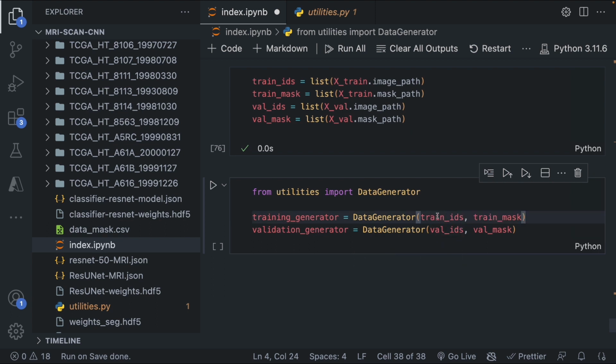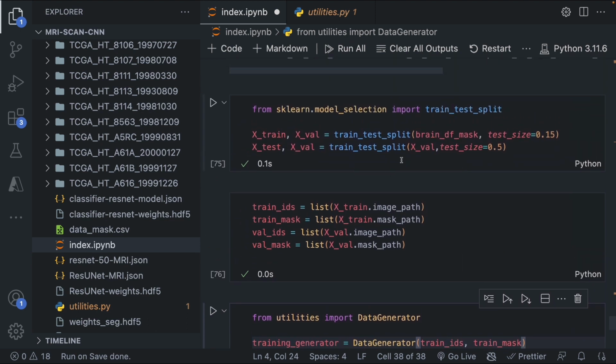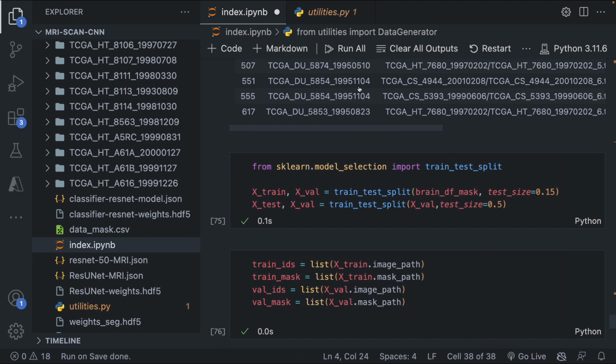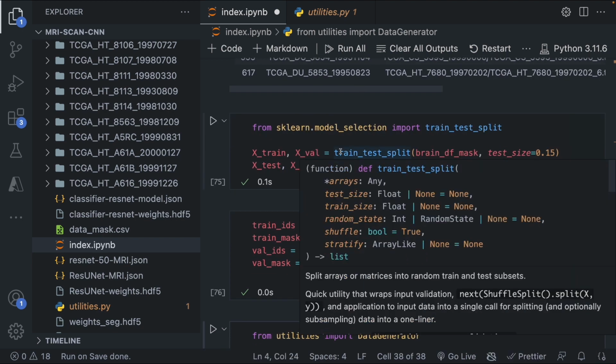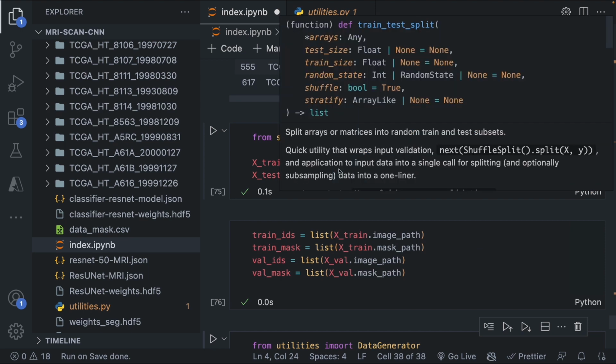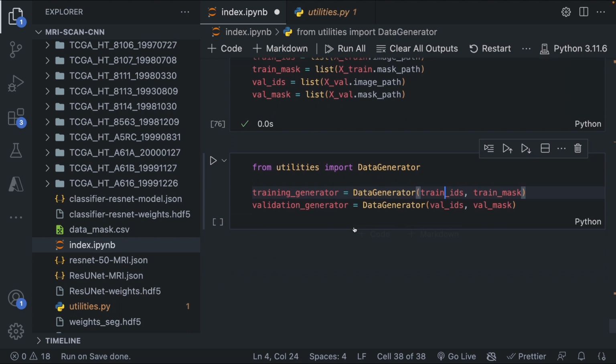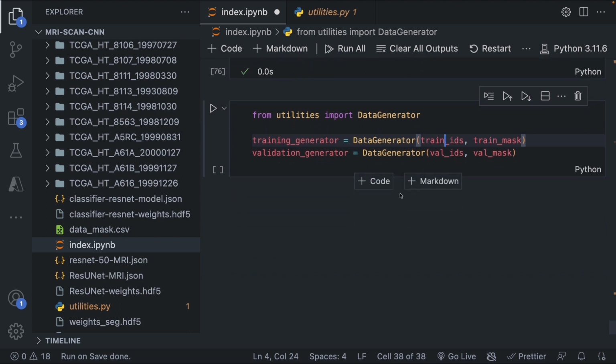So here we notice we have our input as an image and our output as an image. This is unlike the first one we did where we have the images and it's predicting for us a 0 or 1. In this ResUnet architecture, we pass in an image and the output is going to be an image. So the classification is going to happen on the pixel level.